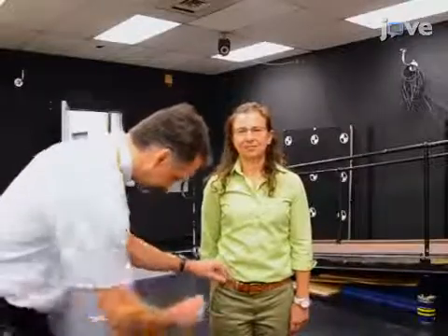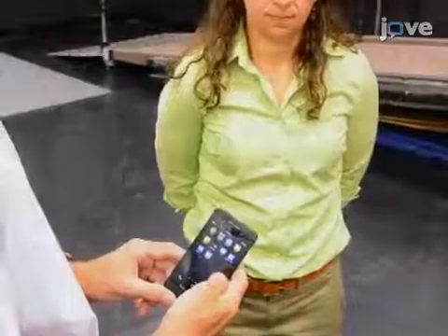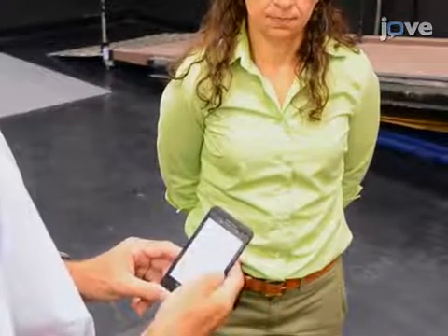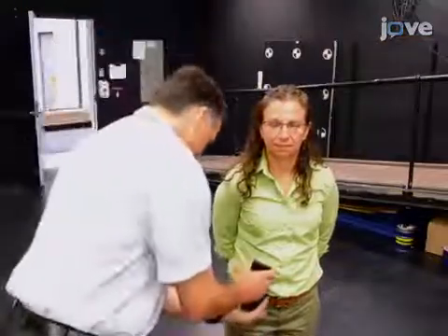Begin by securely attaching a phone holster to the participant at their right front hip. Start the application on the mobility measurement smartphone that is used to collect the sensor data. Then, place the smartphone in the holster with the back of the device facing outward.